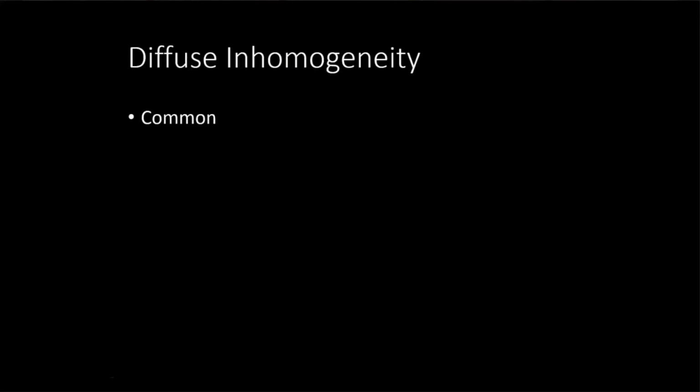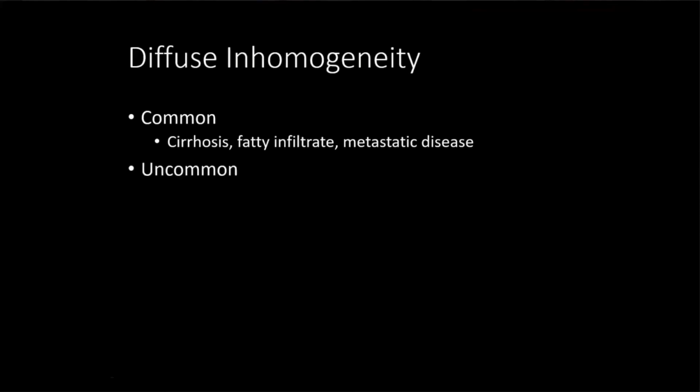The common things that can cause this are cirrhosis, fatty infiltrate, and metastatic disease. But there are some uncommon things too. Carcinoma can cause it, fibrosis, and lymphoma. So this is when the liver just appears diffusely inhomogeneous.